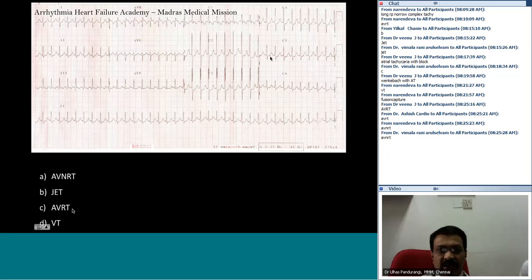But this ECG is a regular narrow QRS tachycardia, no significant ST depression, no obvious P waves, but the P waves can be dug out from the QRS complexes, which are seen. If you have that in your mind, the so-called tiny P waves are seen at the end of the QRS. So the diagnosis most probably in this is AVNRT.